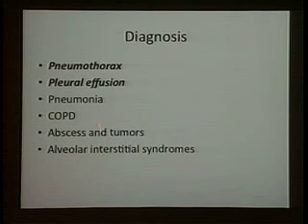There are other things that you can look into, but they're much more finicky. I would say if you can see a big pleural effusion or pneumothorax, that really helps you. And those are relatively easy things to diagnose.